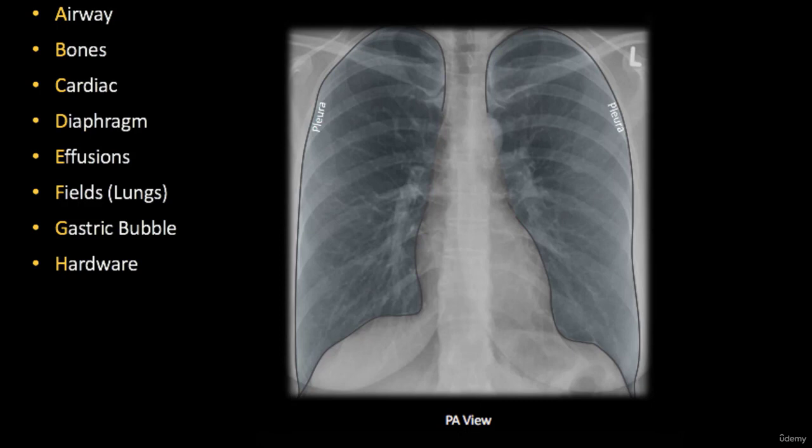And have a look, we have no space between the lung itself and the thoracic wall. They are absolutely adjacent. We have the layers of pleura there, but they are invisible on the X-ray. Any contents like air around is an indication of pathology. We also look at how symmetrical the lungs are, sandwiching the mediastinum in between, in the center. Any deviation here will indicate pathology.